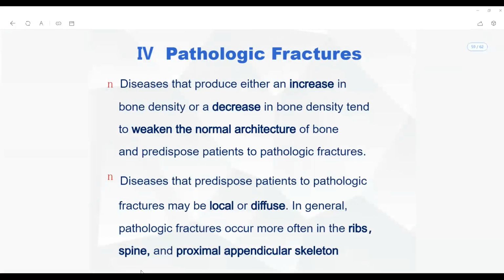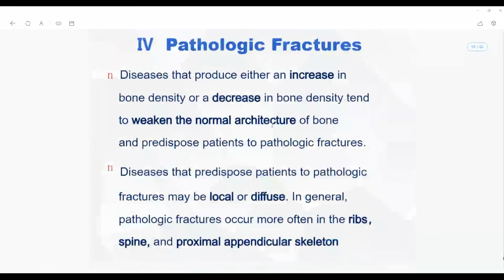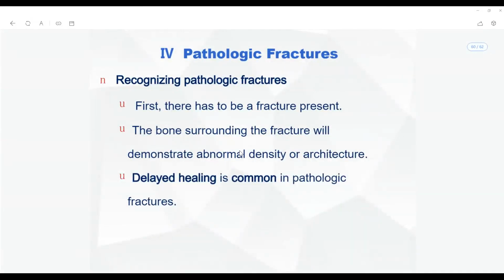Pathological fractures are characterized by delayed healing. That's the reason there will be different densities present here. Either they will be present as new bone formations, or they will be formed as completely osteodestructive lesions. Multiple fractures may be present, and the characteristic feature is a wedge compression fracture.